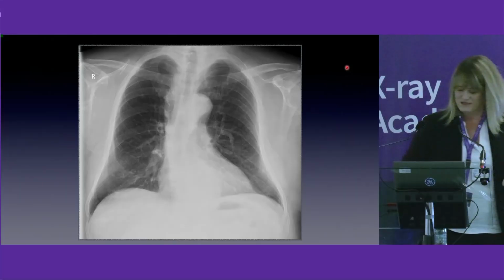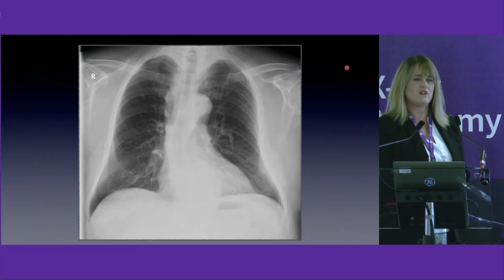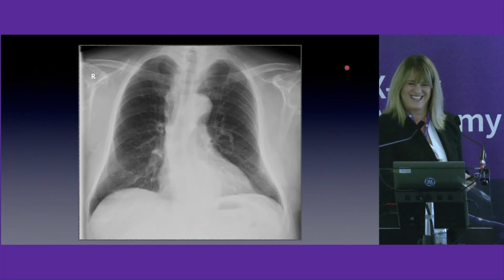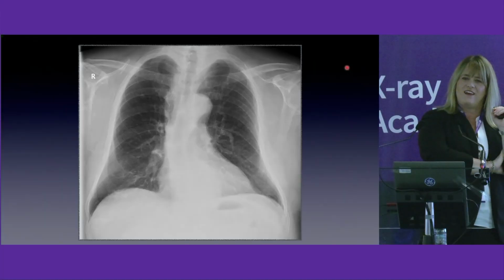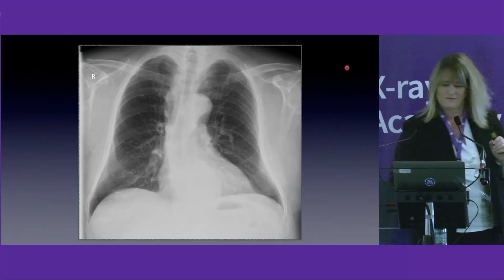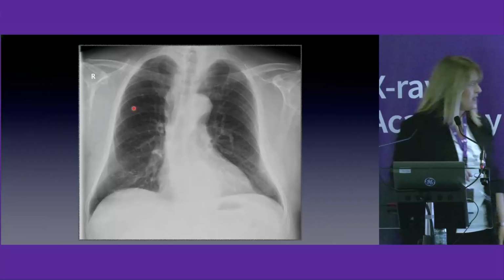No, doesn't work, okay. So scoliosis. Any consolidation? Neria is laughing because she knows. Maybe there is a nodule. One, two, three, four, five. Okay.